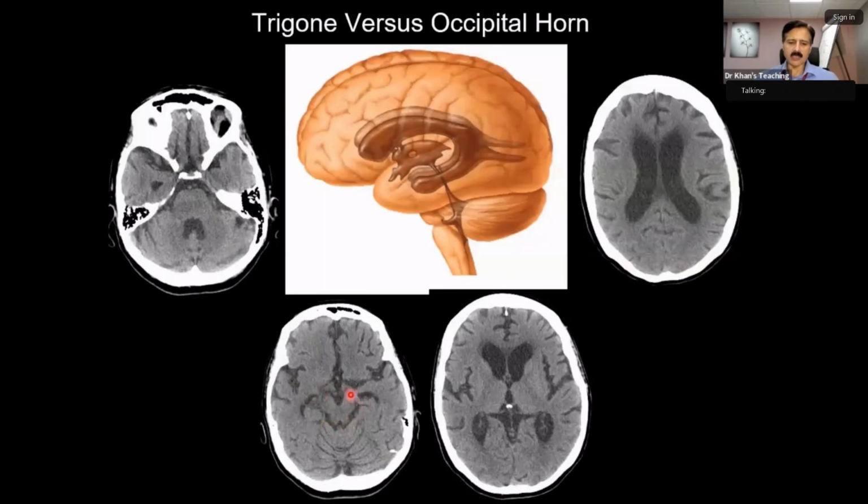Around this, anatomy is very critical. This is the ambient cistern. This is the quadrigeminal plate cistern. This thing is the uncus. What is the uncus? The uncus is the medial-most portion of the temporal lobe, and this is the structure which dips into the incisura, into the hiatus, to cause transtentorial herniation. When it slips inside, it will compress this, and this will be displaced to the contralateral side.